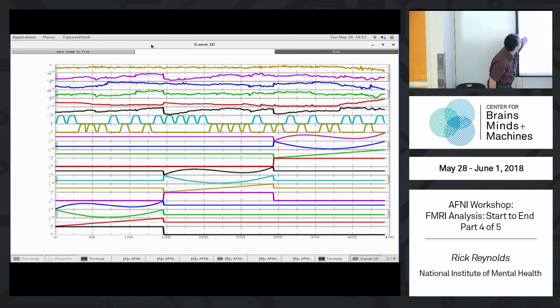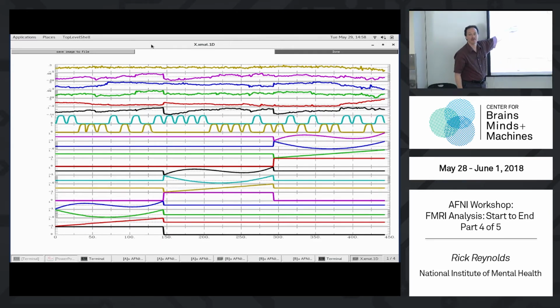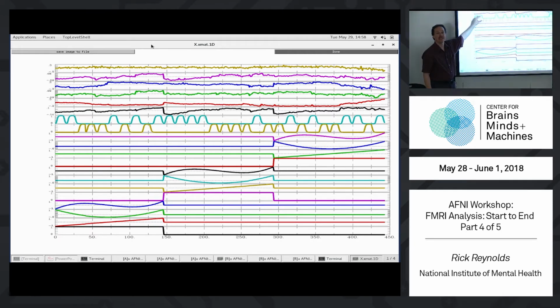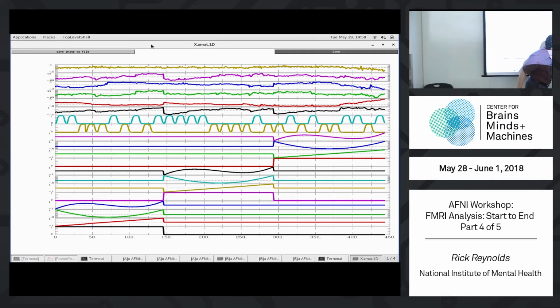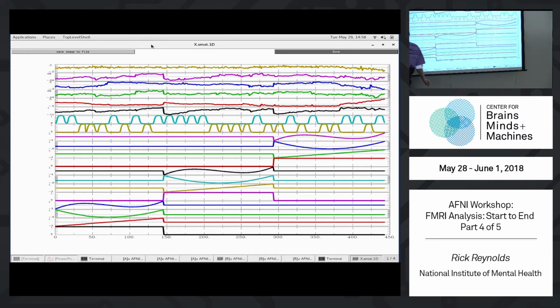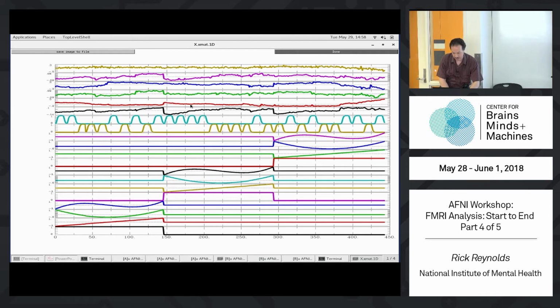Let me direct you to this. Does this look a little odd right here? Hard to see. It's a little chopped off. This is a censored matrix. This is after censoring. This is missing 6 time points, including, I forget, 3 or 4 right up here. It should actually go all the way out to 450, and it does not. So let me leave this on the screen.